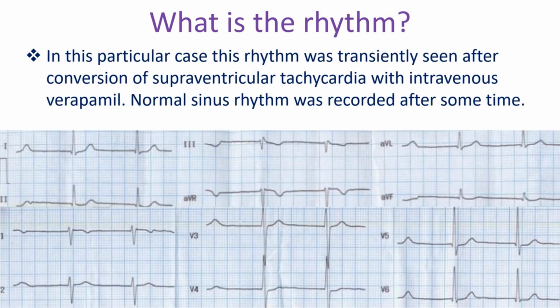In this particular case, this rhythm was transiently seen after conversion of supraventricular tachycardia with intravenous verapamil. Normal sinus rhythm was recorded after some time.